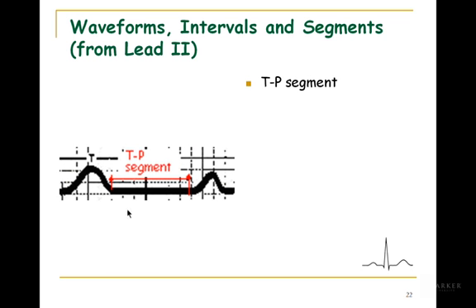Now, the T wave represents repolarization of the ventricles. You already knew that. It's not very symmetrical, it's usually a little asymmetrical. In most leads, it is positive, but it doesn't have to be positive or upright in all the leads. It can be inverted in standard limb lead 3, and you may also see it inverted in your chest lead V1, and not be concerned about it. The voltage shouldn't be more than 0.5 millivolts or 5 millimeters in height.